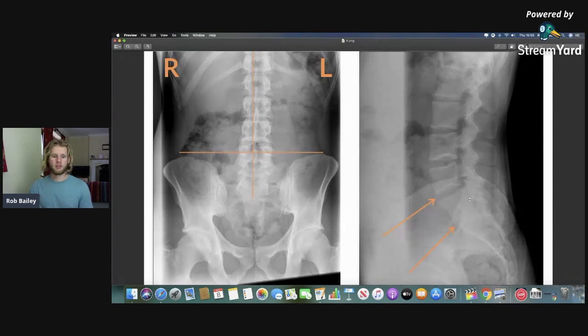Now, the reason that I'm showing you all of this is a lot of my patients have shown me x-rays, and their spines look much nicer than mine does. Okay. So I've got disc degeneration. I've got arthritis into the facets. The spine isn't straight. My pelvis is lower on one side, so it's kind of all out of alignment, really. There's wear into my hips. I actually don't really ever have any pain from the stuff on this x-ray.